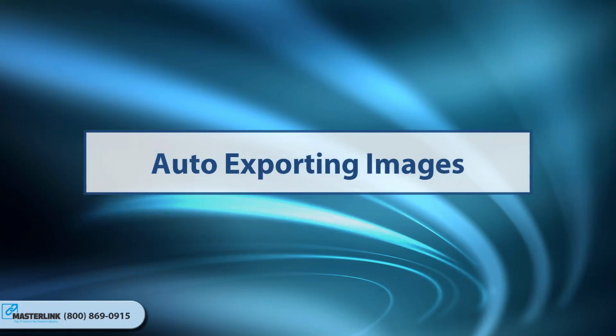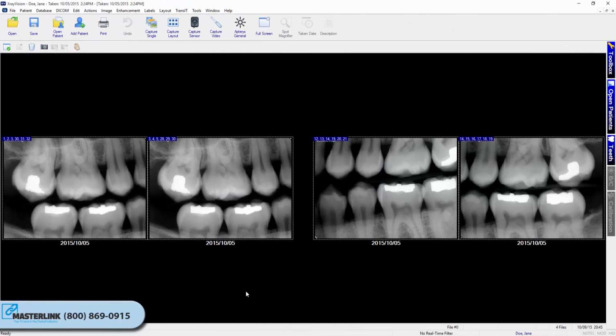Auto-exporting images. XrayVision's auto-exporting functionality requires an initial configuration before it can be utilized. Once the auto-export is created, a toolbar or toolbox button can be created for it, so that users can send images out of the software with one click.